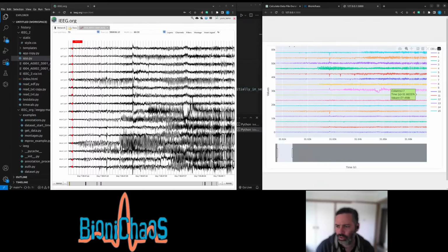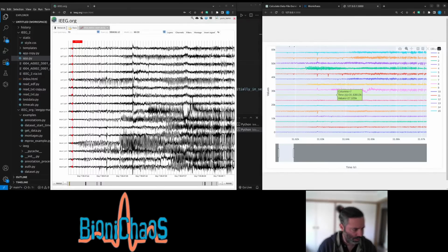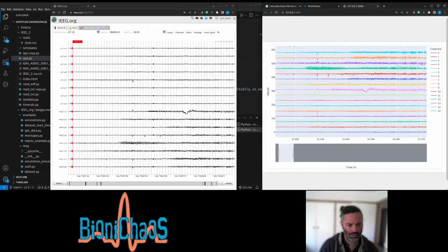It must be this bit here. So that's right channel. Right, so they shifted for me. Yeah, I have that right of 4.